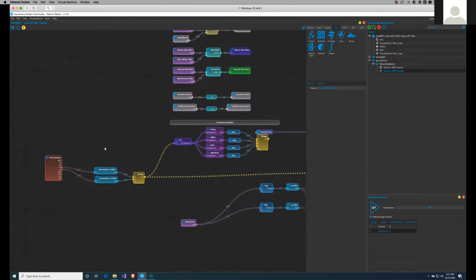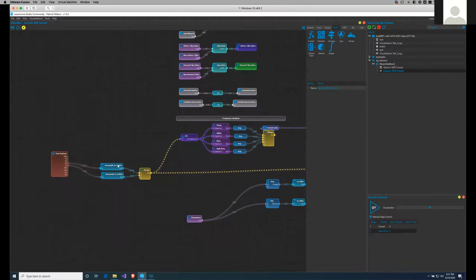So it starts off with the test system here. That particular classifier is currently set up to work with 220 Hertz. So in the input, we resample to 220 Hertz. The classifier, of course, can also be changed to work at a higher or lower sampling rate. That's also up to you. The same drill if you want to make modifications to it: right-click, copy to personal folder.